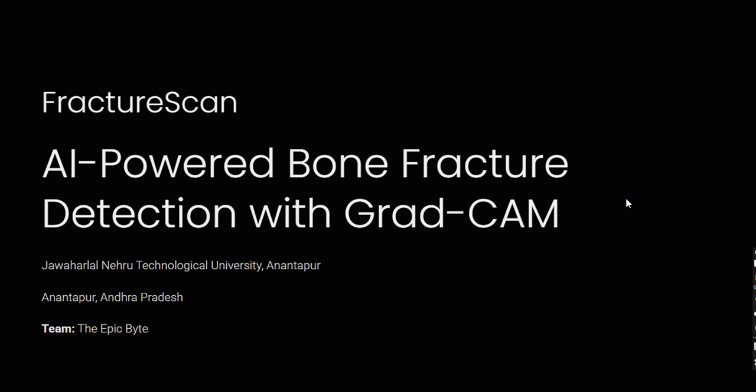Today, we present FractureScan, an AI-powered system that detects bone fractures from X-ray images and explains its predictions using visual heat maps, enabling faster and more reliable clinical decision making.